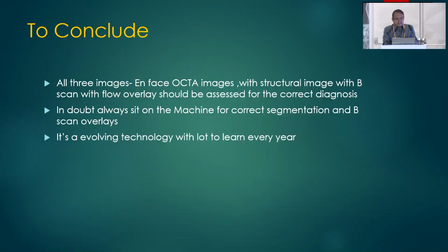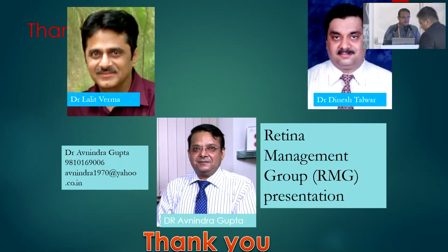All three images, the en face OCTA images with structural images and B-scan with flow overlay, should be assessed for the correct diagnosis. In doubt, always sit at the machine for correct segmentation and B-scan overlays. It is an evolving technology with a lot to learn every year. Thank you very much.